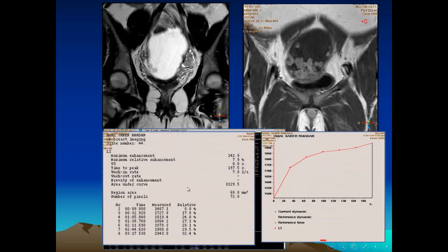On dynamic contrast enhanced imaging, we know the time to peak and the washout curve, and we calculate all this. The curve is rising. This is a benign curve; we have 3 types of curve, and this is the benign one, so this is towards benignity. But due to the large solid components, I feared that it may be borderline.